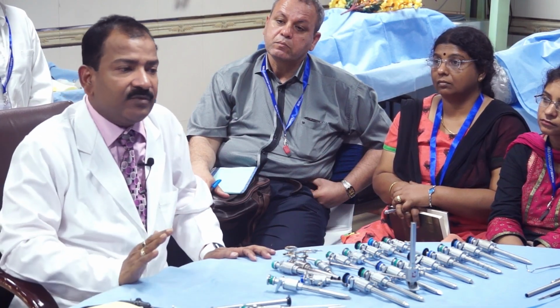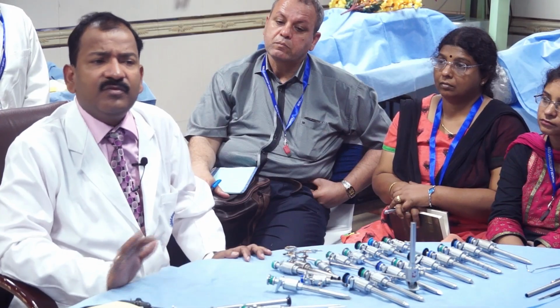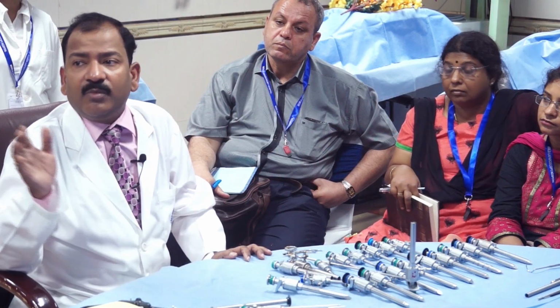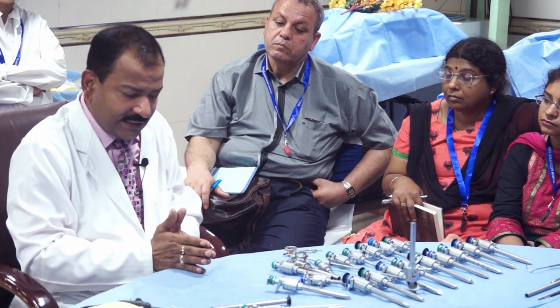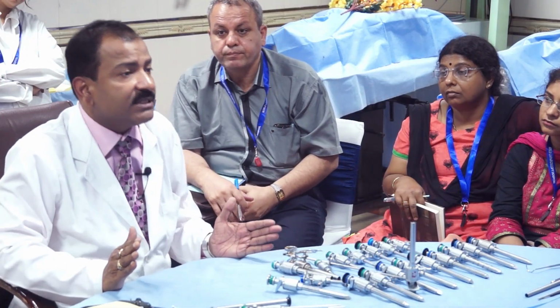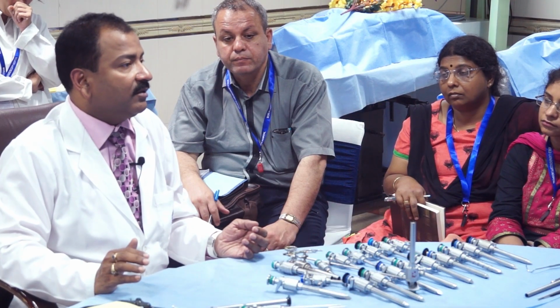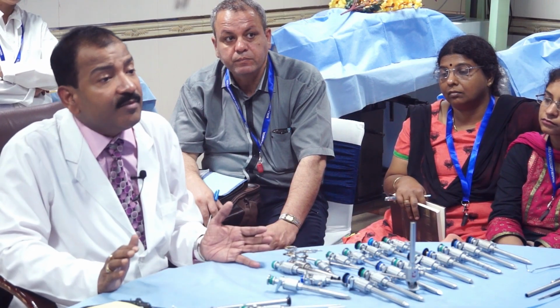Once you learn the engineering part, you will get a lot of confidence, and then you will not have to depend upon anyone. You can even ask the instrument company. Say you bought a generator. You should know that an electrosurgical generator should have a minimum of 500 kilohertz to a maximum of 3.3 megahertz frequency, and which frequency you buy depends upon how well you can do the surgery, and which tissue wants which frequency of generator.